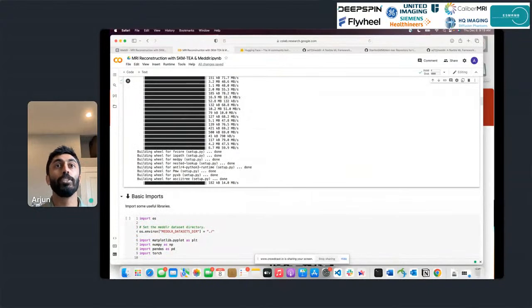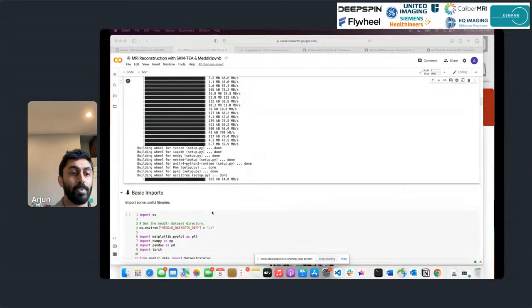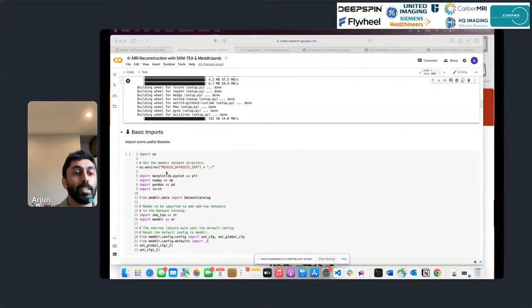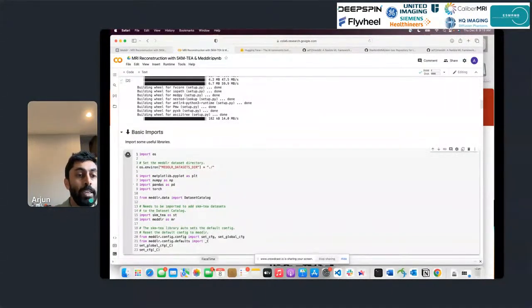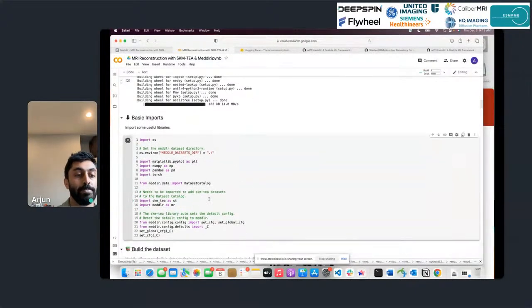If there are questions, I'll be monitoring the chat, but feel free to interrupt me as well. I want to make sure that everyone's able to understand what's going on with these different pieces. So as with standard Python syntax, we're going to go ahead and import some libraries that are quite useful. So I'll just go ahead and do that. A lot of the setup is pretty much boilerplate, just importing a lot of the libraries that we're interested in using downline.